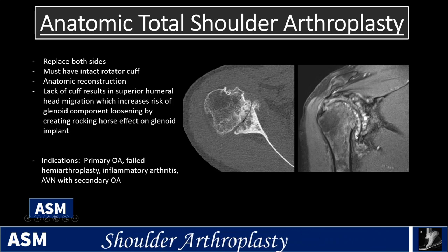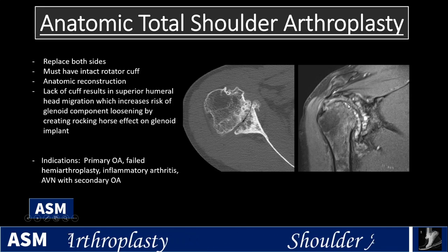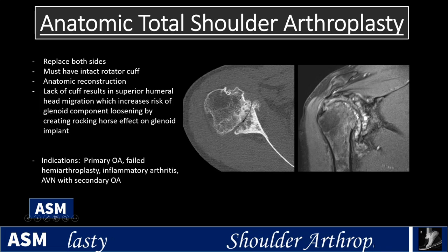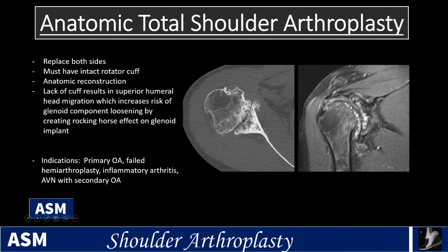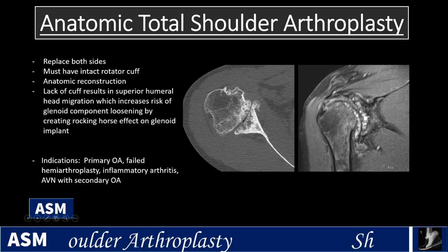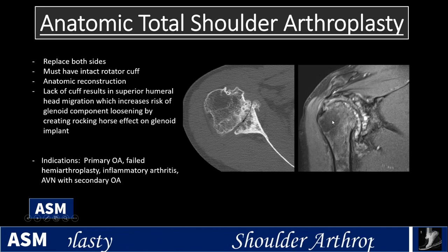Joint space narrowing, these osteophytes coming off the humeral head, sometimes likened to a goat's beard. And you've got the end plates, the subchondral bone plates, I should say, of both sides of the joint are irregular. There's subchondral cysts, edema, sclerosis. So this is typical of primary osteoarthrosis.